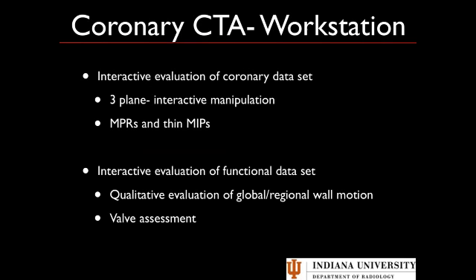Interpretation. In general, we're always going to use the workstation to do interactive evaluation and interpretation. Basically, the way I read all of my patients, even to this day, is using the 3-plane MPR interactive and manipulating those. Mostly I use MPRs, especially if you're looking more at the anatomy. Thin MIPs can also be used. You can also perform interactive evaluation of your functional data set.